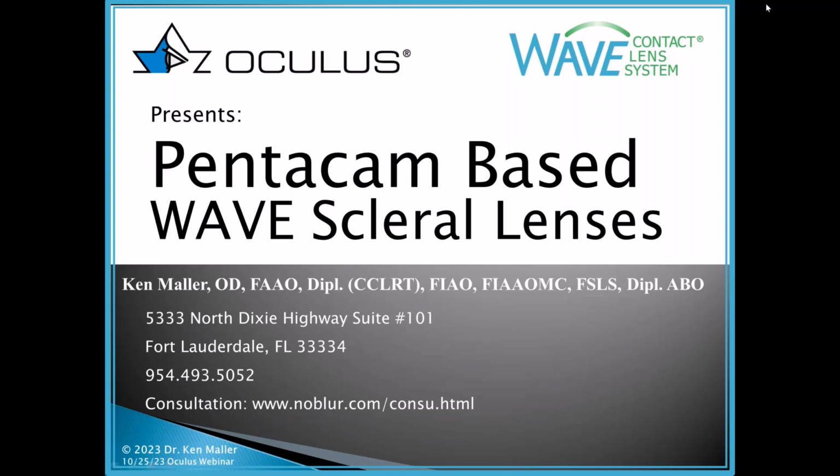Hopefully, I'll be able to give you a little bit more insight into some of the abilities that the Pentacam can do in aiding you to get to a much better result quicker, more efficiently, and of course using the Wave software integrated with the Pentacam to really create some wonderful magic in terms of lenses. So let's go ahead and get started.